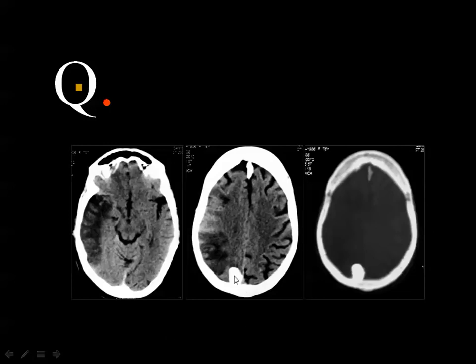And what about this lesion? Yes, and I said that whenever you see a calcified lesion adherent to the inner skull table, it is calcified meningioma and not an osteoma. Osteoma will arise from the outer table of the skull, very common compared to the inner table. But a calcified meningioma is a common incidental finding, and this lesion the patient does not complain of.